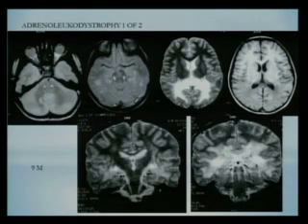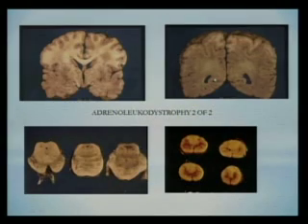It's like, with apologies to Dr. P, who is not here, but in chest radiology, it's like end-stage lung. I mean, anything toward the end is end-stage lung. But if you are shown this, and this is a child, and there is what looks like a dysmyelination in the posterior portion of the brain, think very hard about adrenoleukodystrophy. As you can see, he didn't make it, and these are the brain specimens.